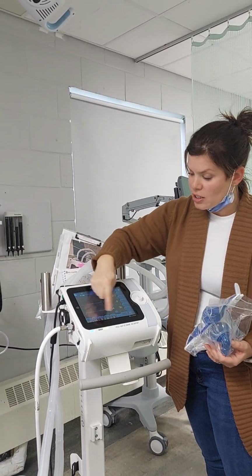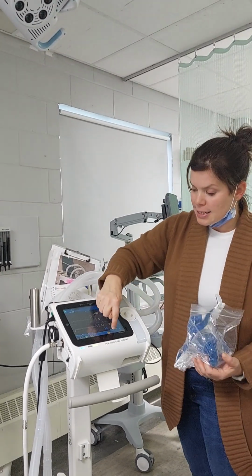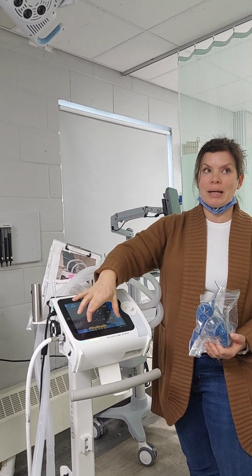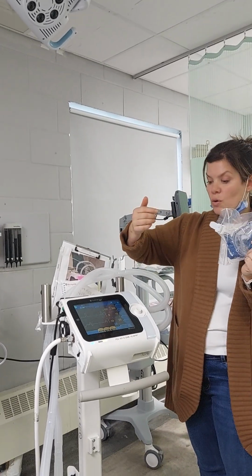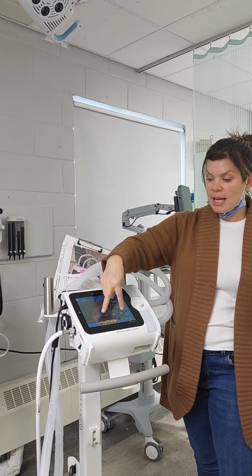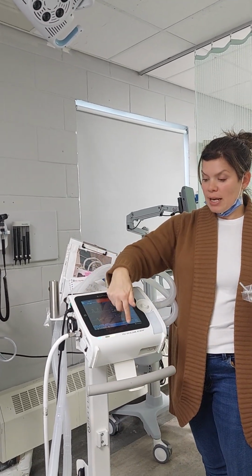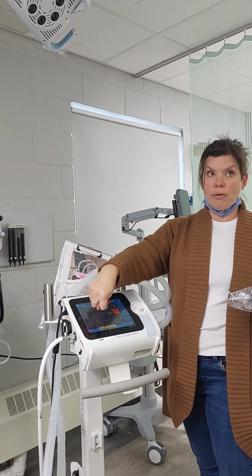Exactly. So you can change that here. If you scroll through on BiPAP and CPAP, it has this yellow button, the only two settings I believe that have this. It's a rescue setting. Lots of patients don't like this mask. If your patient goes into respiratory arrest or codes, so they stop breathing, these settings will come up after about 20 seconds. It recognizes the patient's not breathing, goes to that rescue setting, and delivers more tidal volume and more pressure, with a resp rate of 15.